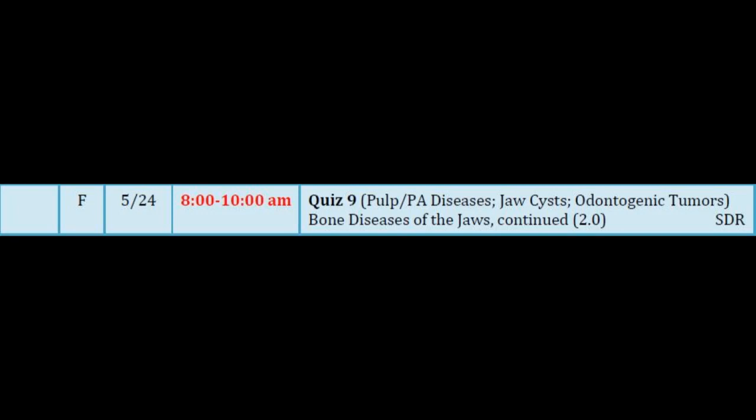Upper left, upper right, lower left, lower right. Which quadrant? Lower right. This is the lesion. A vague, ill-defined radiolucency. They can be hard to see. If it's a female, top of my list would be metastatic breast. If it's a male, top of my list would be lung. That one ended up being prostate.